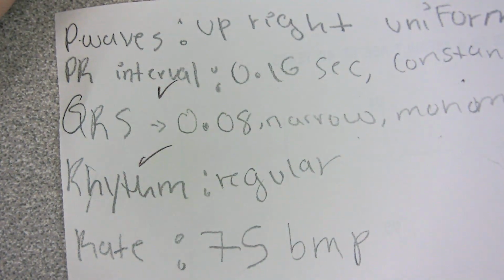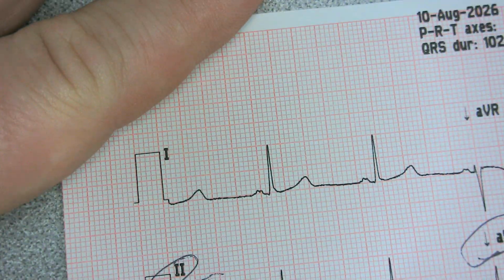All right, let's talk about the rhythm. She says that this is regular. All right, let's see if she's crazy or not.